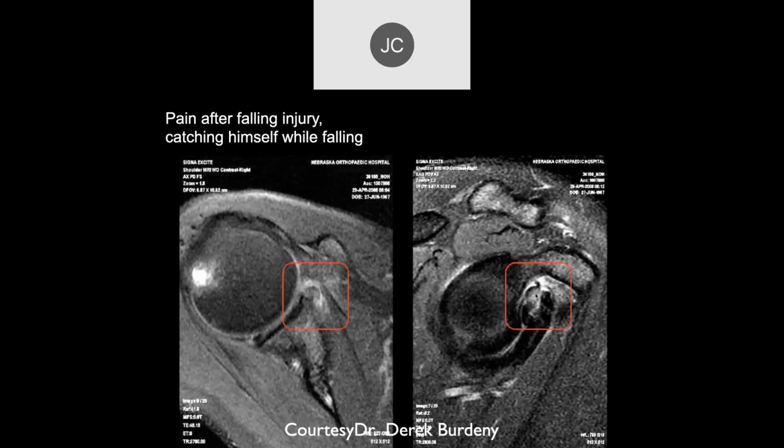Well, what do you see here? The sagittal images are actually helpful in figuring out what a lot of this anatomy is. There's some edema there, and then that. But notice that this is a linear structure. Generally, it's very serpiginous here. Usually, linear structures in the body are straight or gentle curves. What sits in this area anatomically? Could be labrum, or it could be the middle glenohumeral ligament.